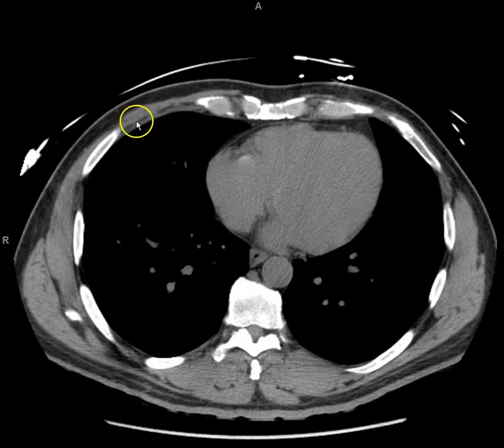And soft tissue is some form of gray. Fat is usually a darker gray. Muscle is a little bit brighter. You can see some muscles here and some fat here. There's some thick skin here, thin skin there. And you've got your intercostal muscles here. Okay, so what is this organ here? What do you think it's made of? Muscle, good. What do you think it is? The heart. The heart, that's right.